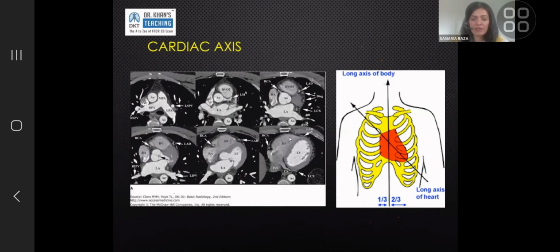So if you then measure the LV wall here and say it's thickened, if it's not an ECG-gated scan, you don't know if that scan is systolic or diastolic, as in, at that specific instant, was the myocardium contracted or not contracted. The value we use for LV wall thickness is measured in diastole. So the heart has to be maximally filled with blood, the myocardium has to be as relaxed as it can be, and then you measure the thickness of the heart.